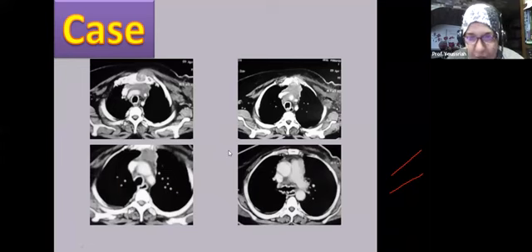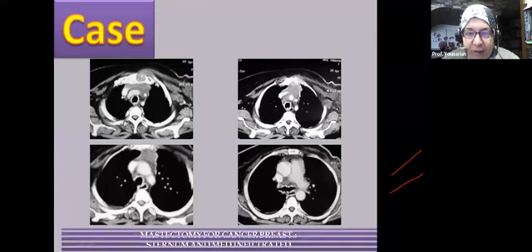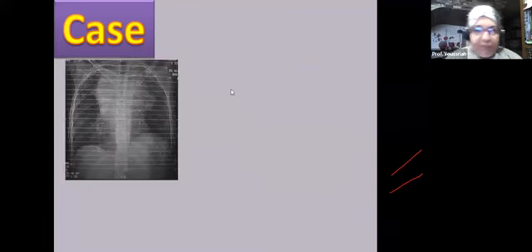Now, white lesions. There is replacement of the fat in the mediastinum by a diffuse white lesion. As in this case, this was a case of left mastectomy, as you can see here, and there is focal local recurrence infiltrating the sternum and infiltrating the mediastinum. As you can see, there is erosion of the sternum and infiltration of the mediastinum. This is a case of metastasis with infiltration of the chest. This was a white diffuse lesion.